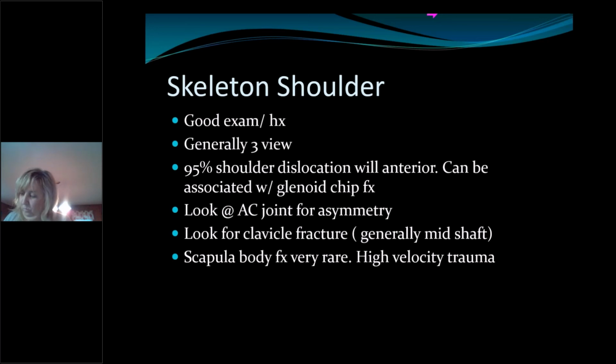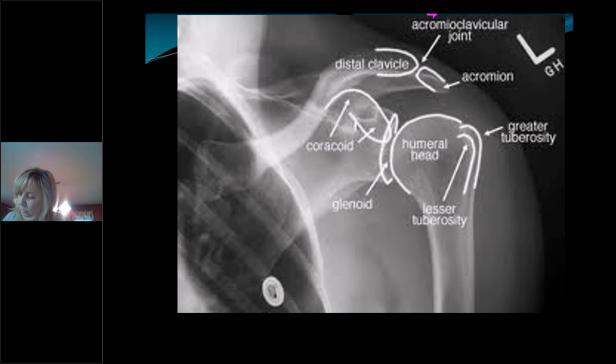So yeah, it's a little outside the scope of primary care, but again, you see some of the things. If you're seeing that, hey, I need to be thinking there's probably more going on than just a skeletal injury. This is diagrammed out for your edification. You've got the distal clavicle, the AC joint is this guy, and again, that acromioclavicular ligament is what goes across here. So when people separate their shoulder, that's what gets injured, and that allows it to ride up.